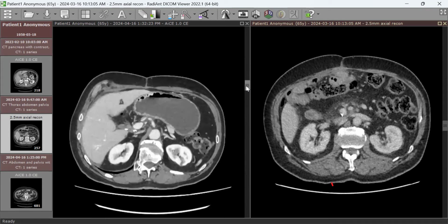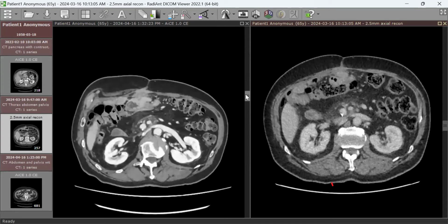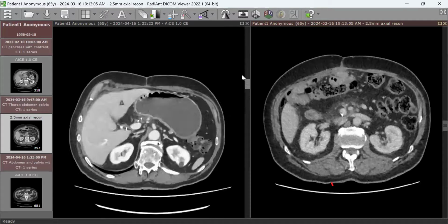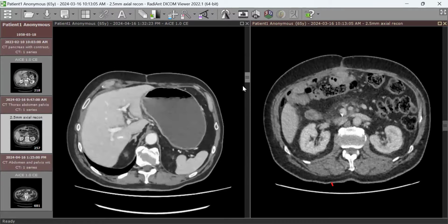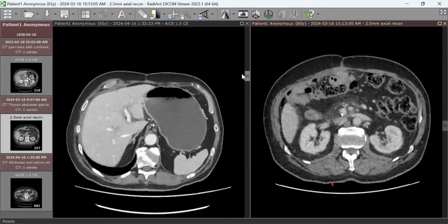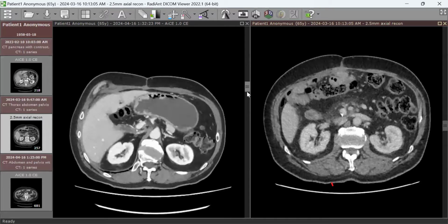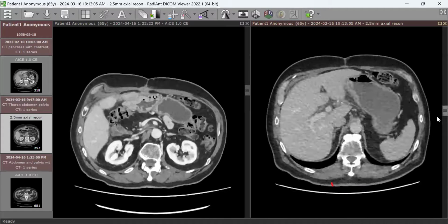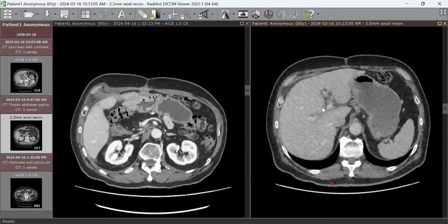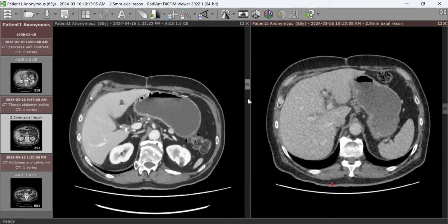And so thank you so much, doctor. That was excellent. I presented this case just to emphasize the need to be able to identify post-surgical appearance. Sometimes it's not that easy, but you do your best looking at the scans, looking at the provided information in the history, and also previous scans and patient record to know what kind of surgery, because without that, you won't be able to identify any complications or to follow the whole story and come up with the right conclusions. Thank you so much.